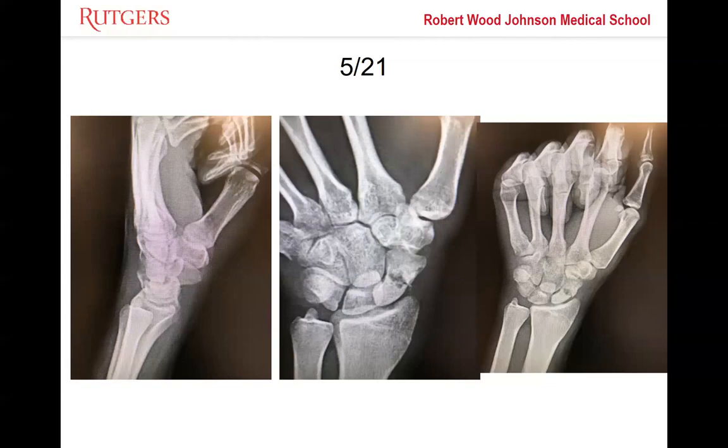Where is he displaced? Maybe. What do we call these things right here?